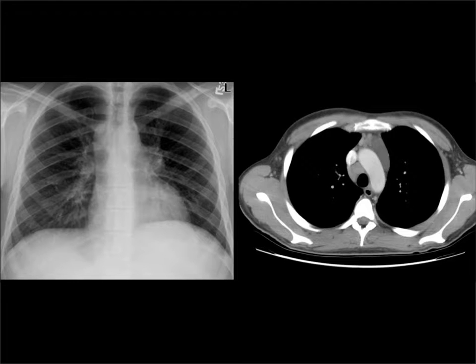We said, however, that there were normal lymph nodes there, so guess what? Anything that causes adenopathy can produce adenopathy of that azygos nodal area. This is a patient who has lymphoma. You can see that she has a big fat lymph node sitting right in the azygos. She's also got more adenopathy, which is lying against the aortic arch, a little bit more difficult to see there.